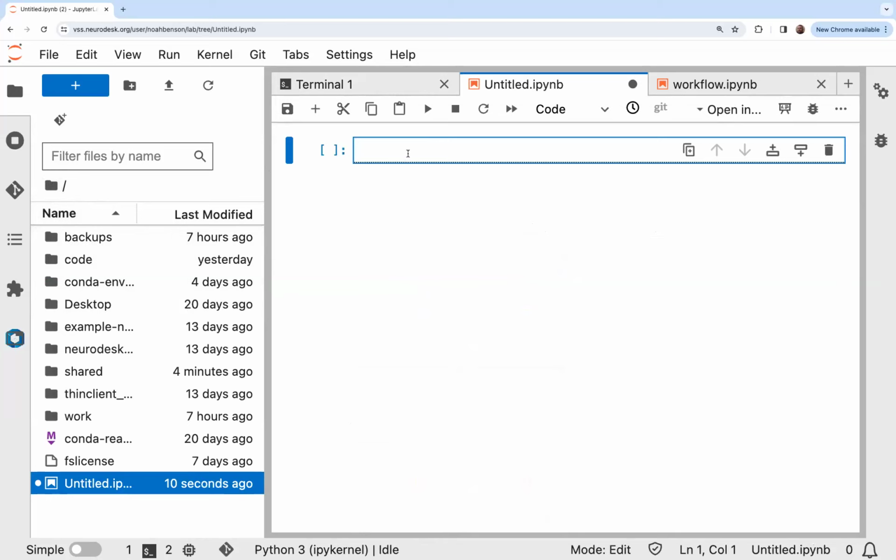Okay. So this notebook is going to be our entire pre-processing pipeline. Now, good practice would be to write lots of documentation in this notebook, but I don't think you're here to watch me write documentation, so we're going to skip that, even though you should do it. And instead, we're just going to kind of launch right into working on this. So the first thing we want to do is do a little bit of configuration. We're going to tell the notebook where our files are and that kind of stuff.